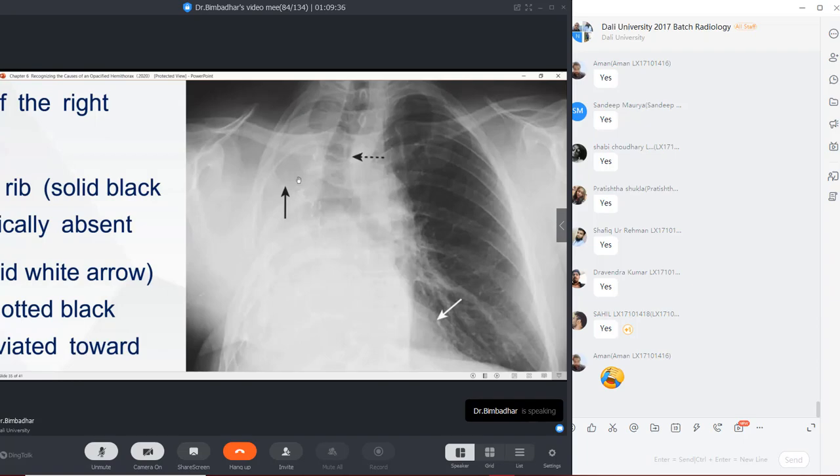And I can also see some organized metallic white shadows here, which means to say there has been a pneumonectomy. Did you get it? And volume loss is seen. So what happens? And you see here the heart shadow is also present down on the right side.